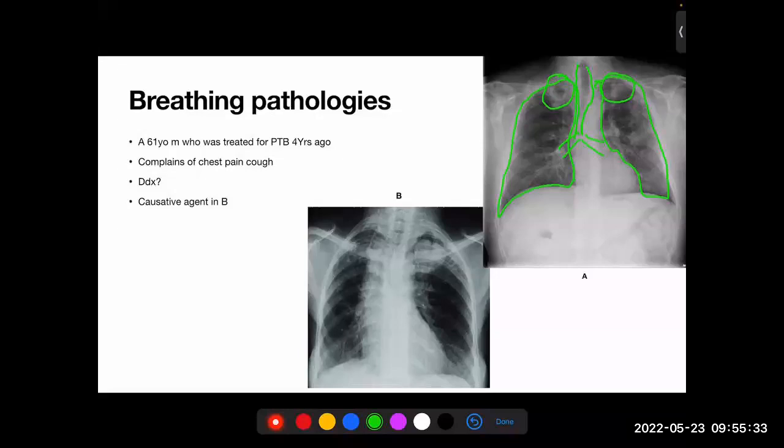Yeah, there is opacity. Is this an opacity, or is there a ring enhancing thing? But the center, is it opacified, or is there a cavitation? That's a cavitation. TB cavitation, eh? Bilateral apical cavitations. I like. So the TB usually has apical cavitation. And then come to picture B.